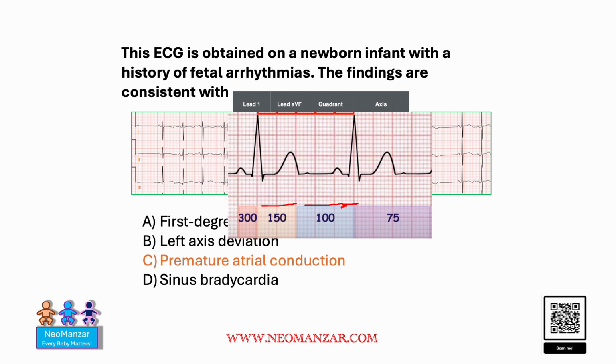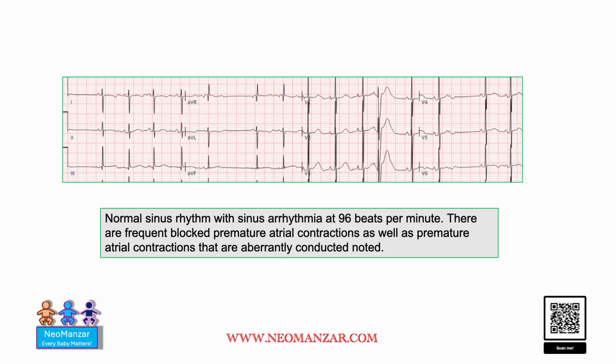So if you see again, let's see, I want to see the one which is falling right at there. So let's just start here. 1, 2, 3, somewhere there. And this is the final reading by the cardiologist, that this is the normal sinus rhythm, and the heartbeat is, like we said, around 100, with the 96, and the premature atrial contractions are not conducted, as you can see here, and then some aberrantly conducted, which you see here. So I hope you find this presentation interesting.